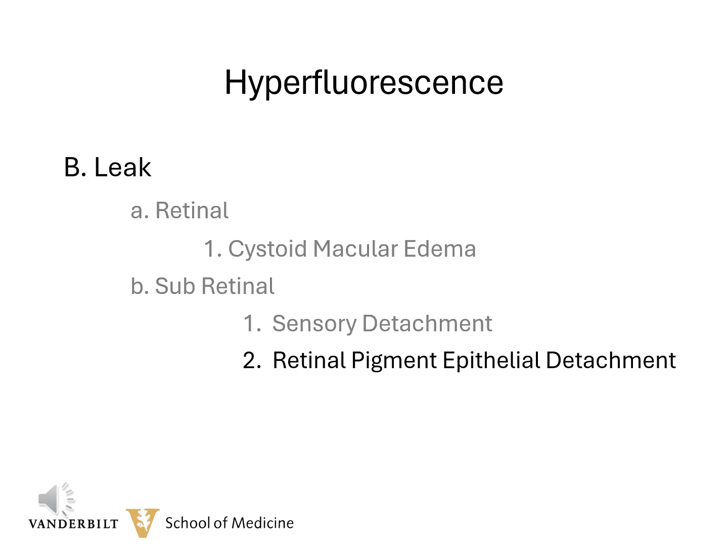Now, in certain kinds of age-related macular degeneration, and occasionally in the younger patient, they may develop a pigment epithelial detachment whereby the retinal pigment epithelium becomes, quote, unglued, unquote, from Bruch's membrane. And if you do a fluorescein angiogram on these people, you'll note the fluorescein leaking into this space and pooling in this space.